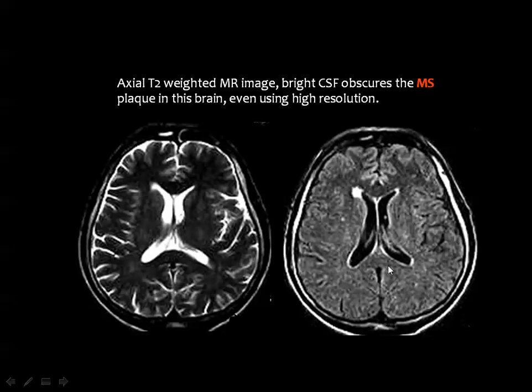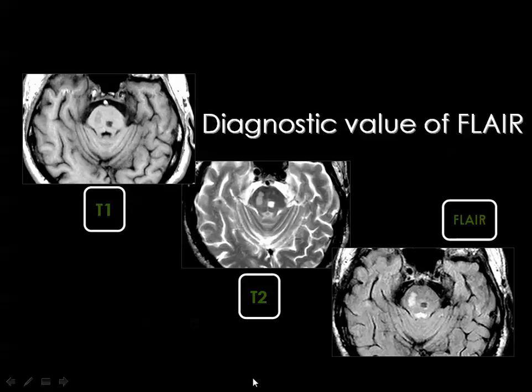But in the FLAIR images, FLAIR means that there is attenuation of the fluid signal, and it is a T2 weighted image where the CSF is black. Then the lesion is bright and the CSF is black, so you have the chance for adequate visualization of this lesion compared to this T2 weighted image.